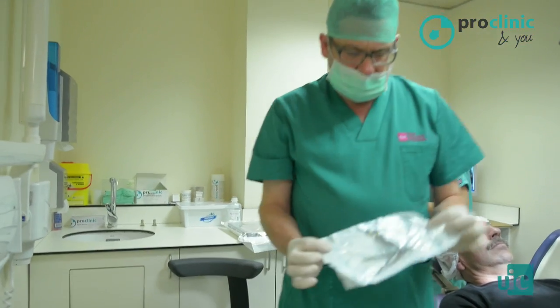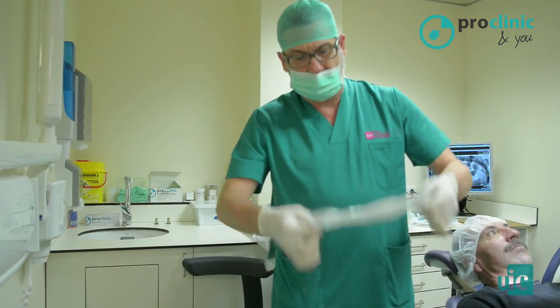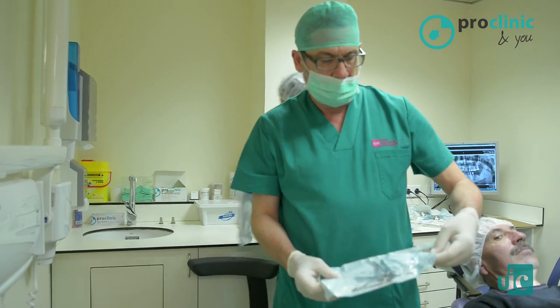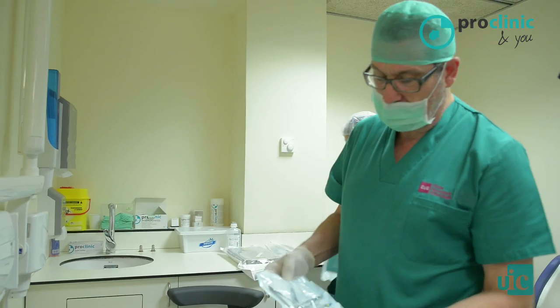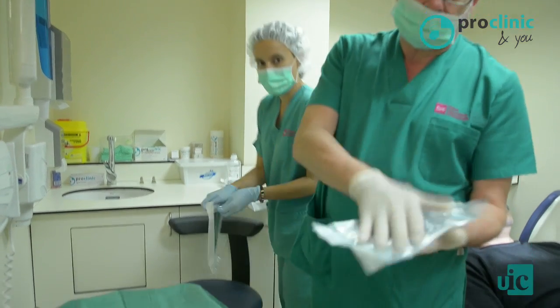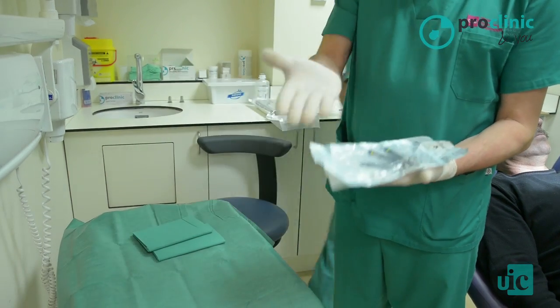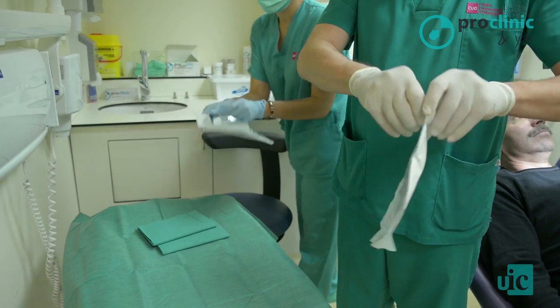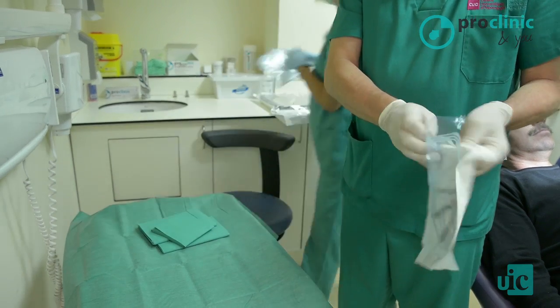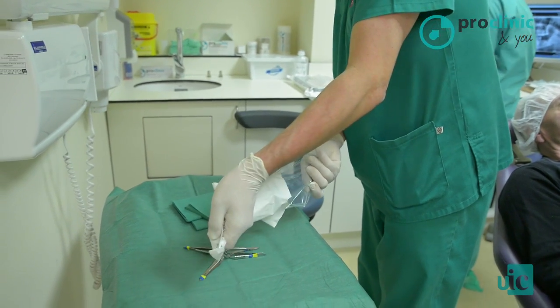Surgical instruments are packaged in bags and sterilized. Sterile bags incorporate markers that indicate if the sterilization has been done correctly. If the bag is sterilized correctly, we will be able to touch the exterior of the bag with our dirty hands, but we won't be allowed to touch the inner surface. We can touch this inner surface of the sterilized bags only with sterile gloves.